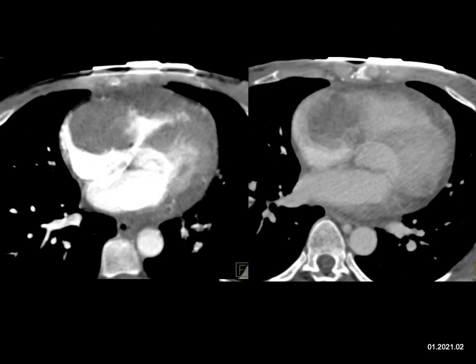I see a mass sitting in the right ventricle. It's hypodense. You can see it on the arterial and venous phase. It's lobulated and irregular. This is going to be a tumor. This is not simply a clot. It's not a great location for clot anyway. That's more likely right atrium, particularly in a patient with a prior catheter in place, maybe left atrium, but not this region. Plus the lobulations, this is going to be a tumor.